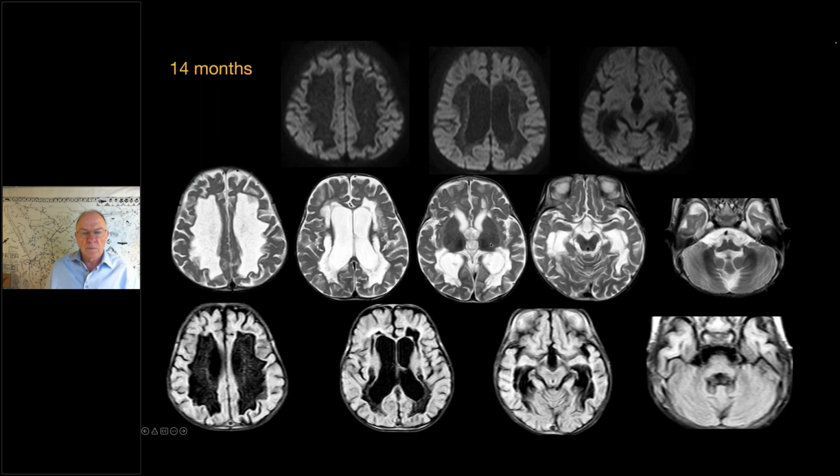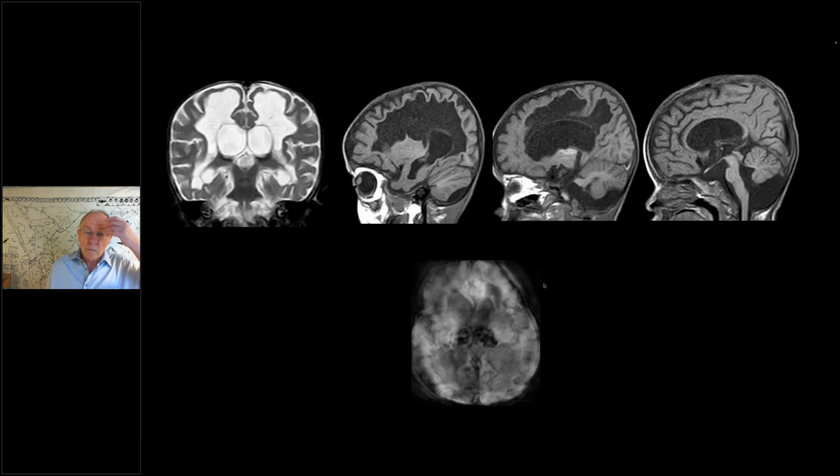There is some degree of volume loss in the bilateral thalami, and you can appreciate that the thalami are slightly hypointense. I do not have an axial T1 weighted sequence, but on the sagittal images, you can appreciate that the thalamus demonstrates T1 hyperintensities, probably residual hemosiderin or calcification. Again, on the sagittal images, you can appreciate the extensive cavitatory white matter involvement. There is a reduction in the volume of the brainstem, and the vermis is reduced or hypoplastic. The SWI sequences are slightly distorted due to motion artifacts, but you can appreciate areas of blooming in the bilateral thalami.